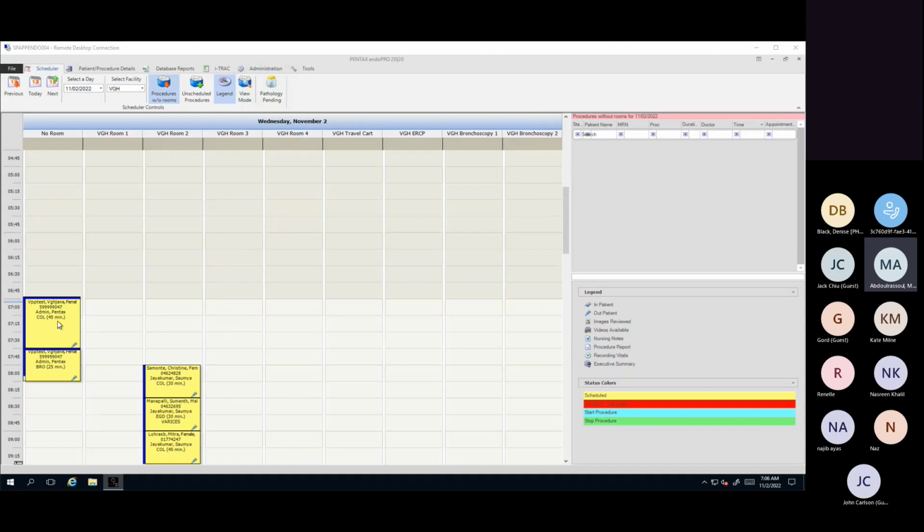In this scenario, we're going to be using these two test patients, VPP test and VGH Jane as the first name. Before I get this show on the road, I just want to confirm, do we have any bronch folks on the phone? Yeah, we have several. Okay, perfect.